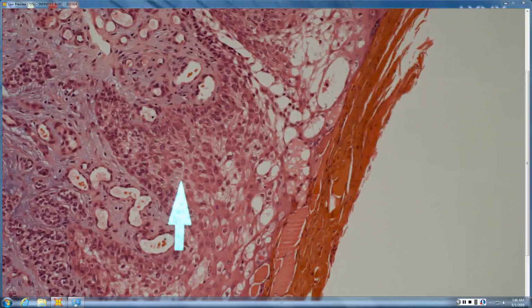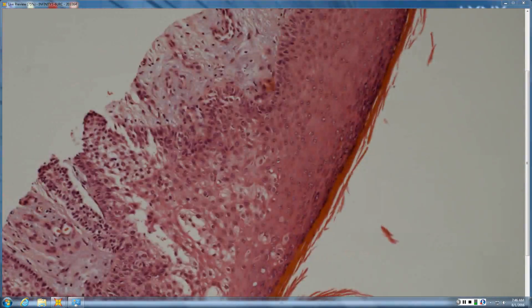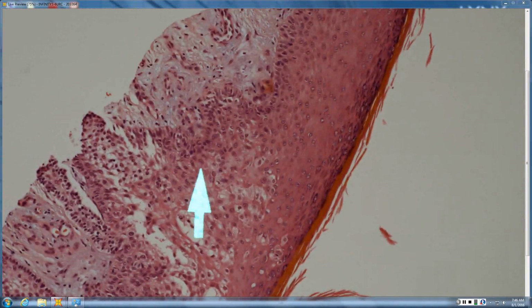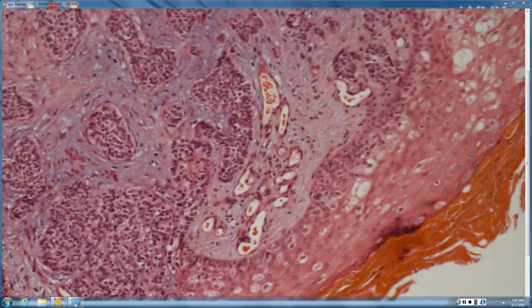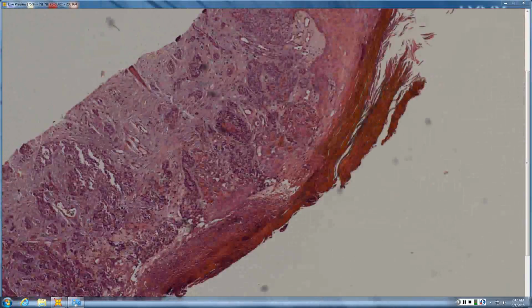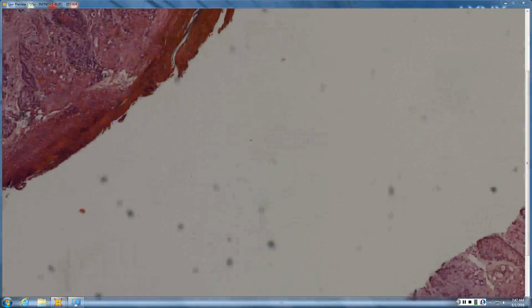What's the pattern over here? Sebaceous. So sebaceous carcinoma will commonly have pagetoid scatter. What else? Definitely see pink keratinization here, right? Just like Bowen's. So Bowen's would be the other thing in the differential. So Bowen's, Paget's, sebaceous carcinoma, which grows in a bowenoid pattern and buckshot scatter in the epidermis.